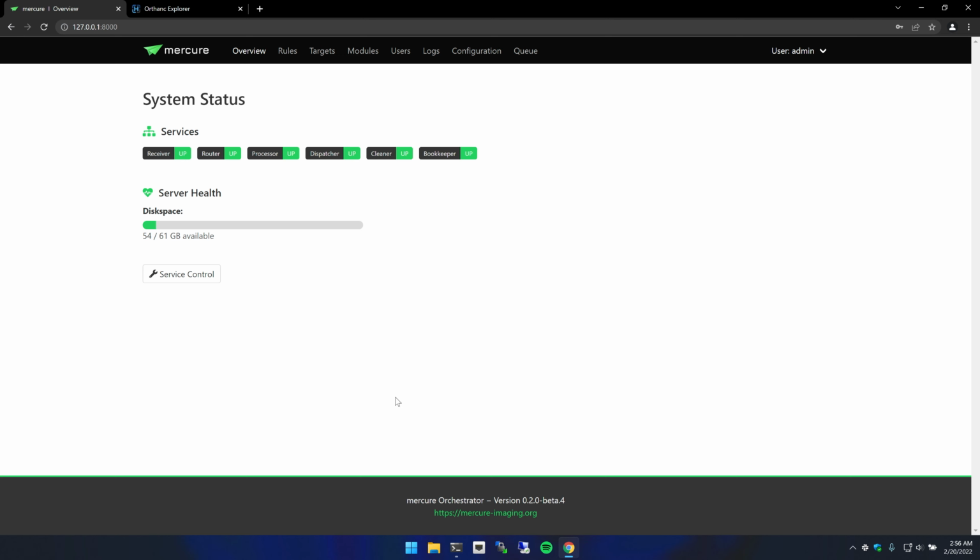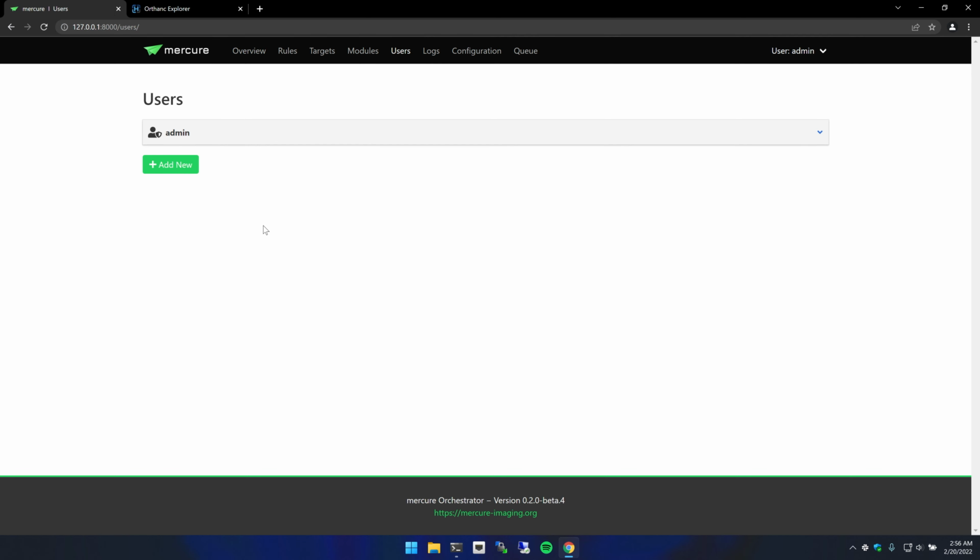And by the way, I used this administrator account to log into the web interface. You can set up additional users by going to this users page here.